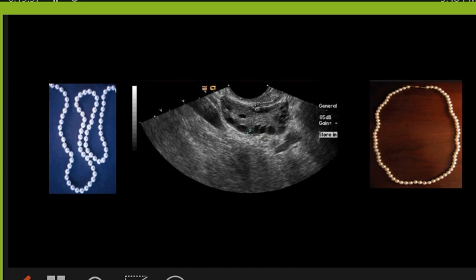These are some information about polycystic ovarian disease. What matters for us as sonographers or radiology: the ovary is large, with peripheral distribution of the ovarian follicles, within normal size, as we said, between 2 and 9 millimeters. Any question on polycystic ovarian disease? Okay, we move to the next case.